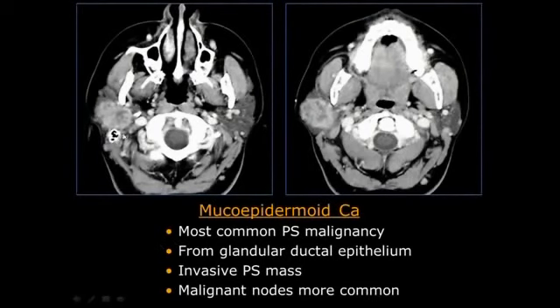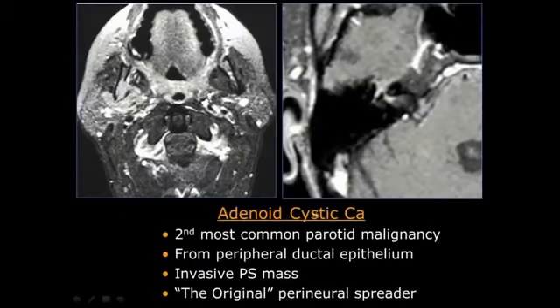Then if you've got a parotid mass that has hairy edges, maybe facial nerve paralysis. Beware, you're talking about mucoepidermoid, adenoid cystic, and some of these are acinic cell carcinomas, squamous, etc. Adenoid cystic carcinoma is the tumor in the head and neck where all the perineural tumor began. And so here we have one that was in the parotid. It's invaded into the mandible. It's on V3 here, and we're all the way up in, and we see that same lesion now coming out the internal auditory canal, having followed the facial nerve all that way.